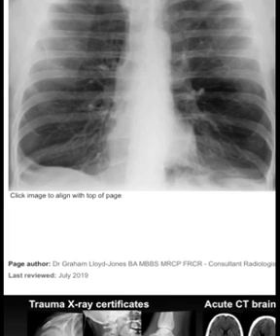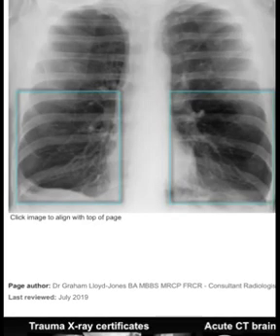Now this is the unilateral black lower zone, asymmetrical lower zones, left darker than the right, and lung hyperexpansion. Clinical information: chronic smoker with increasing shortness of breath. The diagnosis is chronic obstructive pulmonary disease with a large left lower zone lung bulla.